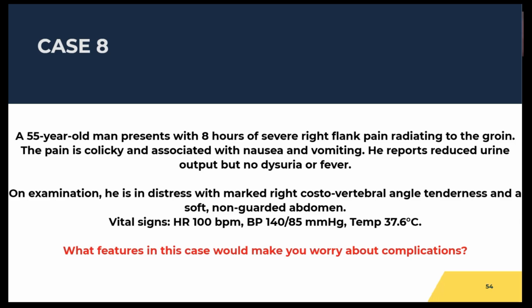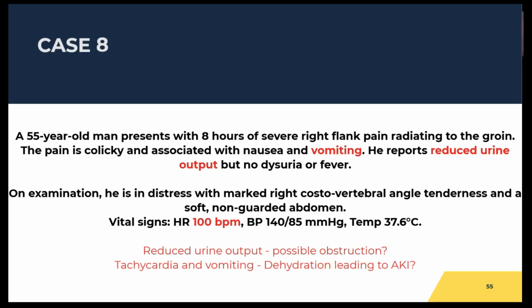What do you see here that might be some worrying signs for the patient? So there are a few things here.